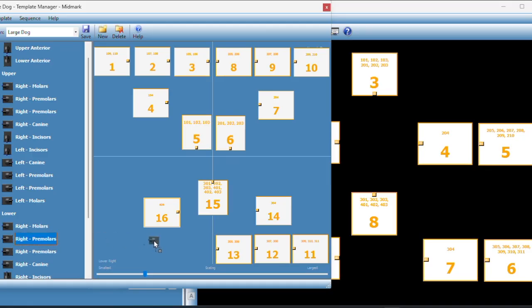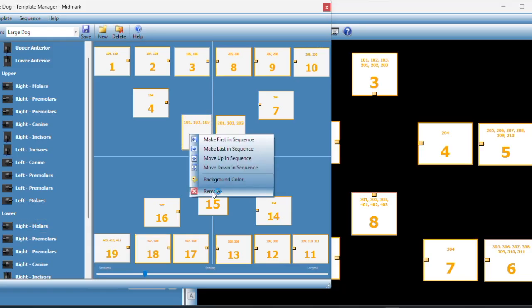And you'll notice that some boxes are in landscape, and the incisor boxes are in portrait. That's important so that they're in the right orientation when we are viewing our completed template. Once we have completed all this, you'll see that the software won't let us put an upper in a lower, or a lower in an upper. It won't let us put a left tooth in a right quadrant, so it makes it very nice.